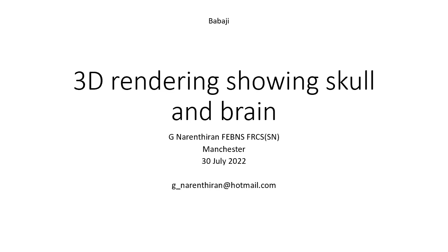At my work, I have got SECTRA. Usually, I have a cut down version of the PACS system, but where I'm currently working, we can get access to the advanced version of SECTRA that the radiologists use, and that's what I have.